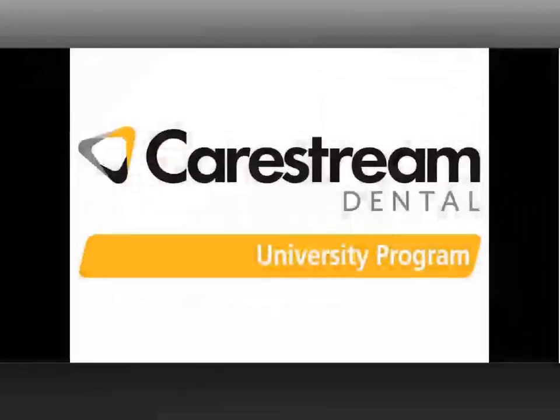Hello, this is Jordan Reese, U.S. Sales Director of 3D Imaging with Carestream Dental. And I'm here with Dr. Shalise Katal as part of our Carestream Dental University program. Today, we're going to do a CBCT anatomical review of the mandible.